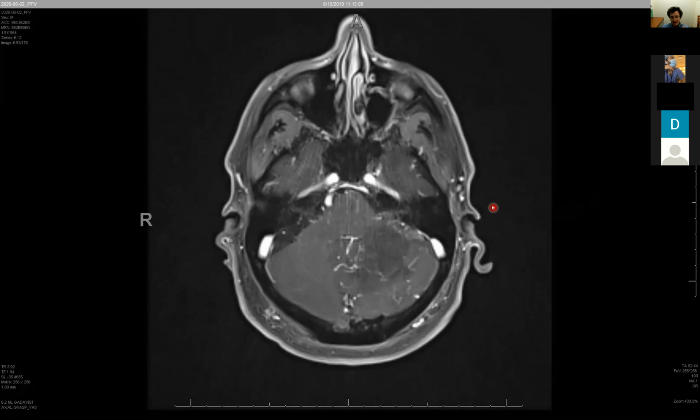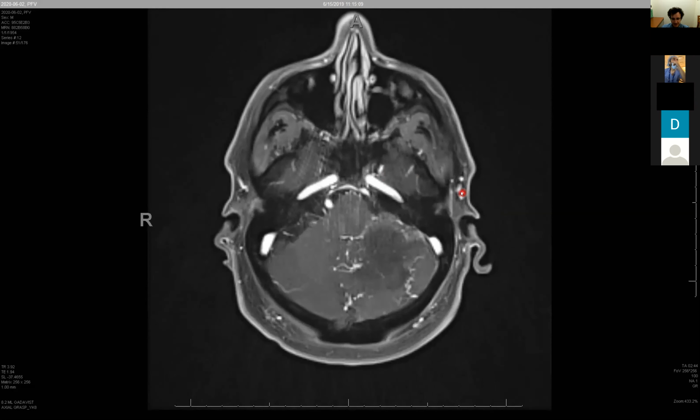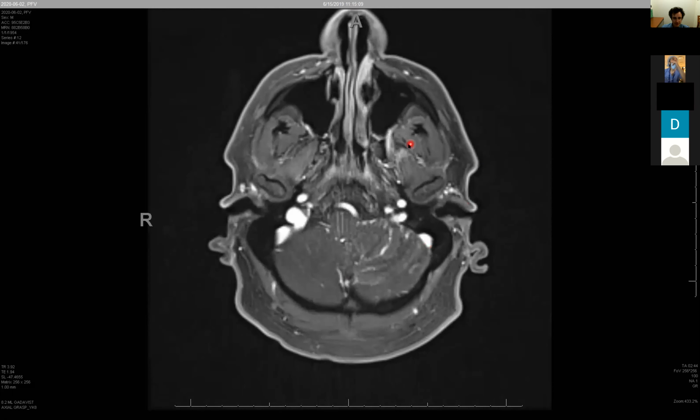Broadly speaking, you have an AVM that's been there for a long time. The AVM has its veins. Even though the AVM might be a much higher flow shunt than this, the brain may be able to tolerate it for a long time because the veins of the AVM are dedicated to its drainage, and the brain has its own veins. The balance is always such that we could talk a lot about how those things evolve and how it becomes unstable because of some venous stenosis or whatever. But fundamentally, here you have a shunt that is using a vein that, assuming these are acquired shunts, used to be some kind of brain vein, and now it's taken over by the fistula.